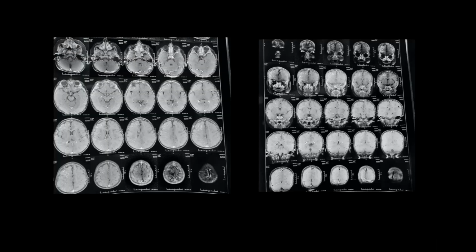So we have external films, and as you have seen in the previous case with Dr. Kavita, these are the post-contrast images, and you have these pial angiomas predominantly on the right cerebral hemisphere. These prominent transmedullary veins, as you can see over here, as linear areas. I think the left side, the temporal and occipital region, also demonstrates the enhancement pattern, which is typical for Sturge-Weber syndrome.